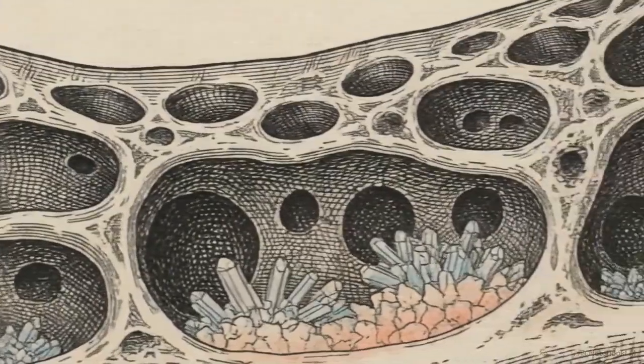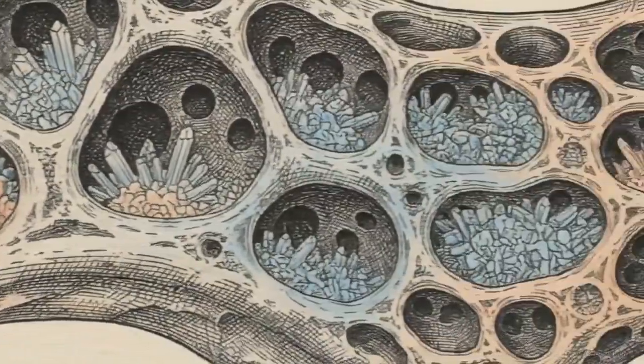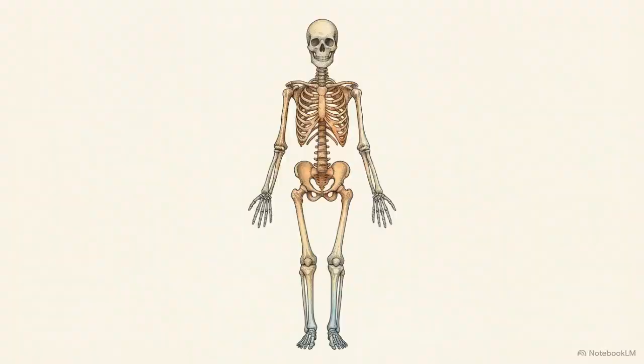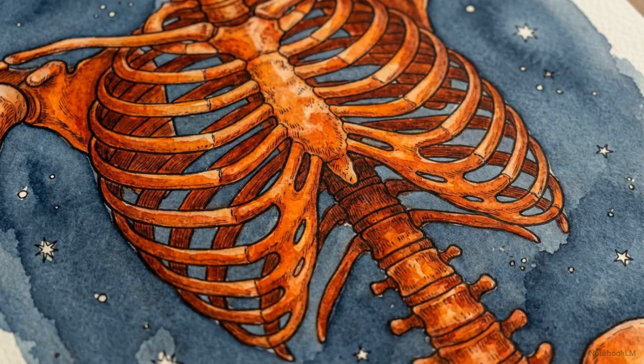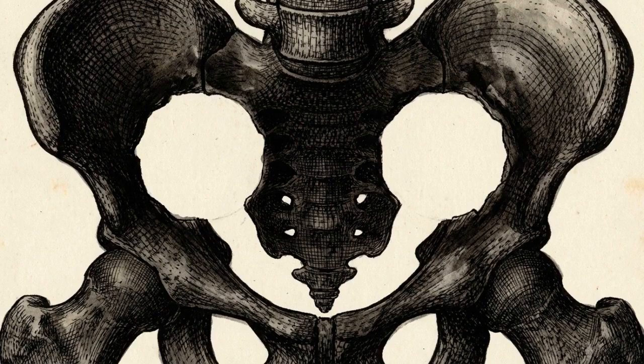Because MDP reflects bone turnover, a worsening scan in the acute post-treatment phase is often the most direct evidence of systemic healing. The third false signal is critical, as severe pathology can mimic a clean, uniform skeleton. This is the Superscan. In this state, widespread systemic disease creates a skeletal environment that absorbs nearly the entire injected dose of the tracer. Comparing a normal scan to a Superscan reveals that the diagnostic indicator is actually what is missing from the image. The defining feature is the total absence of normal renal and soft tissue tracer clearance. The diseased bone has outcompeted the kidneys for the tracer.